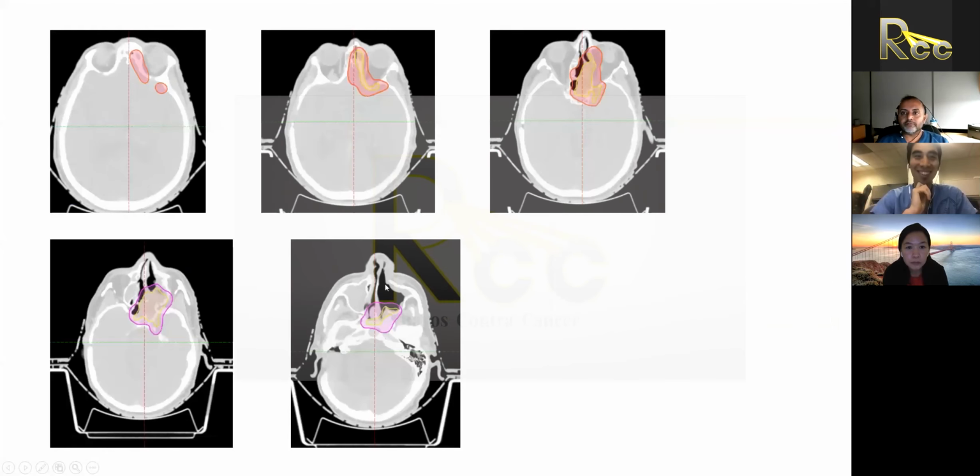So at week 4, I re-simulated the patient to plan for this radiosurgical boost. And so here is the residual disease. What you see here in yellow is the residual disease, and now you can see this volume around there. And you see 2 different colors. You see the red color here and this magenta color here. And this is essentially me arbitrarily dividing the intracranial component, and then coming down here where I felt, here's the upper intracranial component near the globe and the optics, essentially, and then here coming down below the optics, essentially.